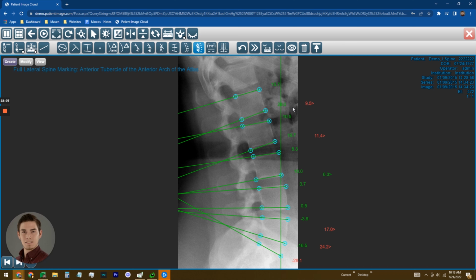Alright, and this is going to show you the measurements and angles of each individual, and then you've got center mass as well. Well, this is not a full body, so we don't have an atlas. So if you do have a full body, then that's how you can use this tool.